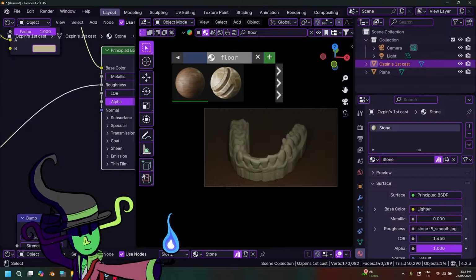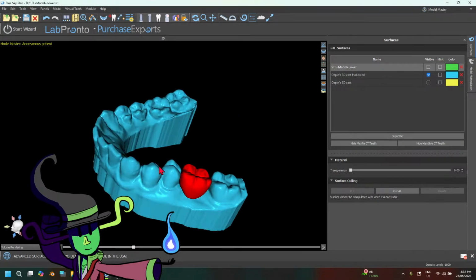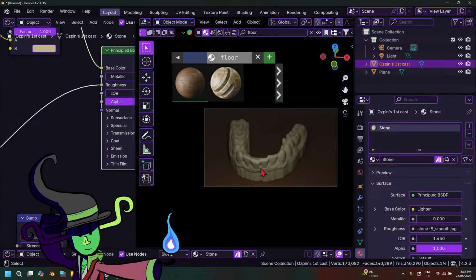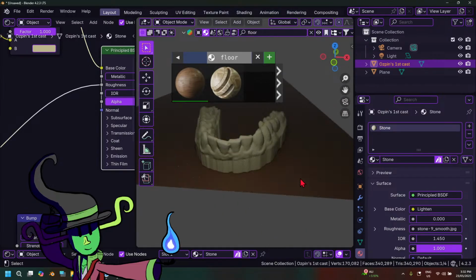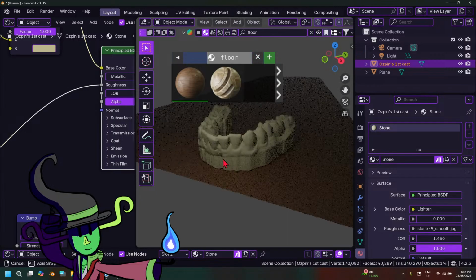any other render you put out in, say, Blue Sky Bio or something, where it really looks like something that came out of an alien movie. But anyway, you can also import some more materials here, like metals, if you're creating dentures or something like that. Acrylic materials are here as well, and you can render it out in Blender.